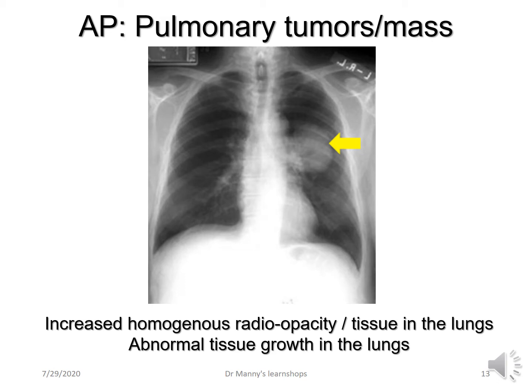And remember, the chest X-ray is just one of the first investigations that will be done. There will probably be a CT done, maybe an MRI done, and this will result in possibly a biopsy. But you're just identifying that you've got increased whiteness for some reason on the left upper lobe.